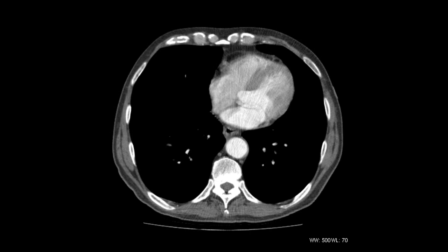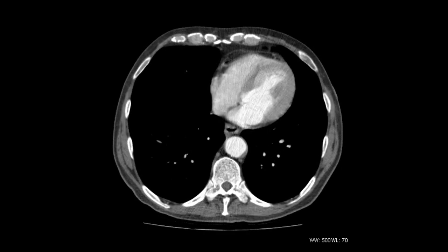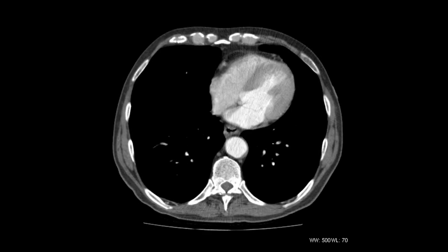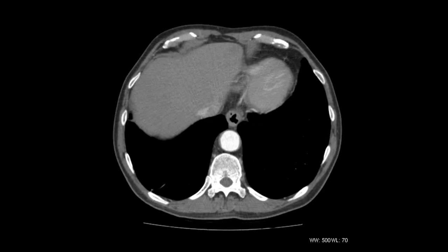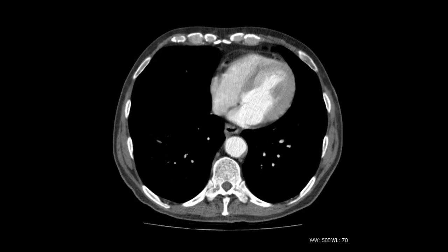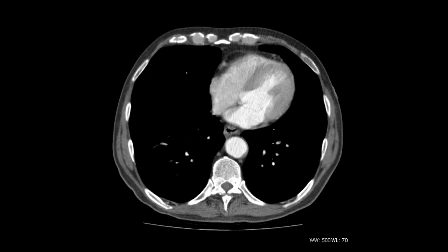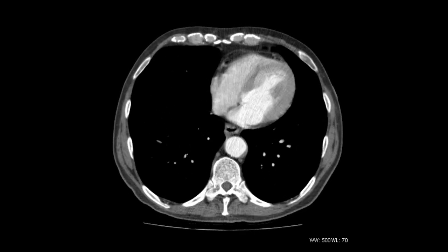So what we'll do is look at a few examples of some pathologies you might see as a surgeon on call, and I'll just show you how I approach a CT. The best way, I find, is to be quite systematic, just so you don't miss anything out, like approaching any other type of imaging. When I first get a CT through, exactly what you do depends a bit on the indication, so the clinical information is crucial. But in order not to miss anything, I tend to go through in a certain order.